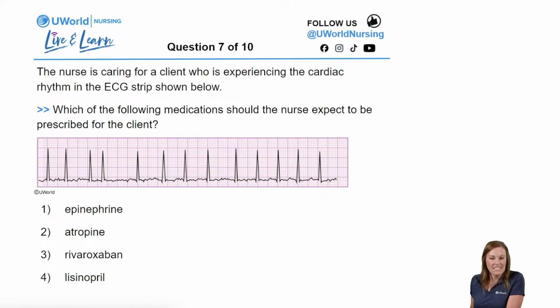All right, good answers coming in. What do we know about this dysrhythmia? This is a 2-step thinking process question. You have to be able to identify what you're seeing and then know expected treatment for these clients. I'm seeing a lot of good answers come in. I'll give y'all about 10 more seconds and we'll pull our answer up.